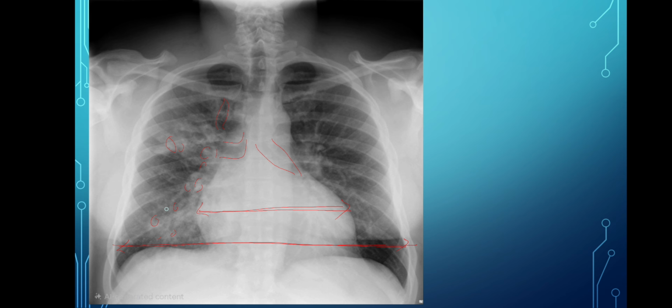Why? Because there is a patchy opacity throughout the lung, increased bronchovascular markings, and an air bronchogram is seen. There is also prominence of the hilum region and bronchovascular markings, and a patchy opacity. This patchy opacity is due to atelectasis of the terminal bronchioles, which are supplied by the bronchus. So this is one air bronchogram.